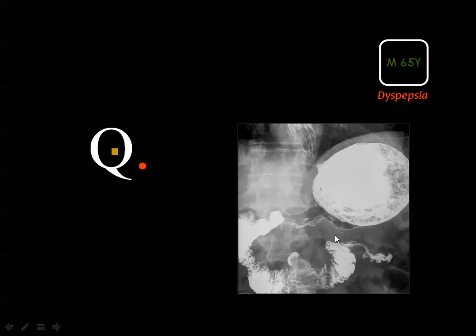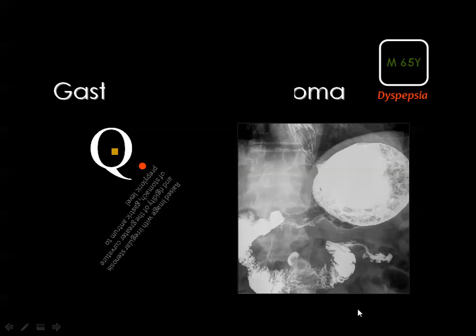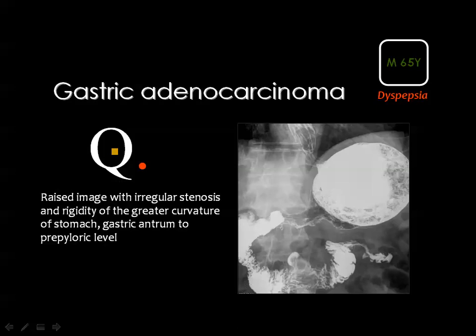Yes, you see that there is significant restriction. This is a barium meal with significant restriction of the distension of the distal part of the gastric body, as well as the pyloric canal, with marked irregularity of the wall and proximal retention of gastric residue and food particles. Diagnostic of gastric carcinoma.